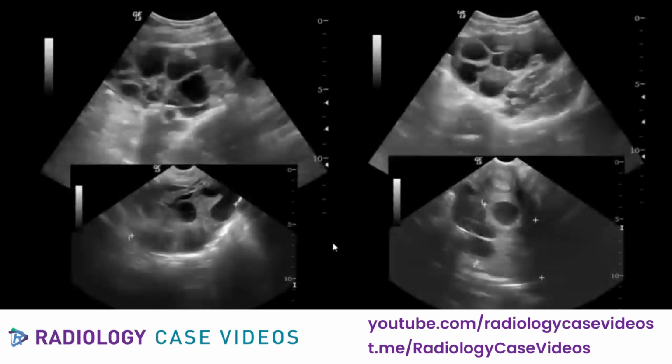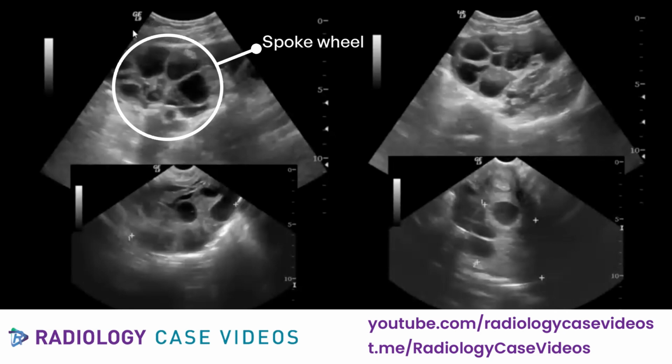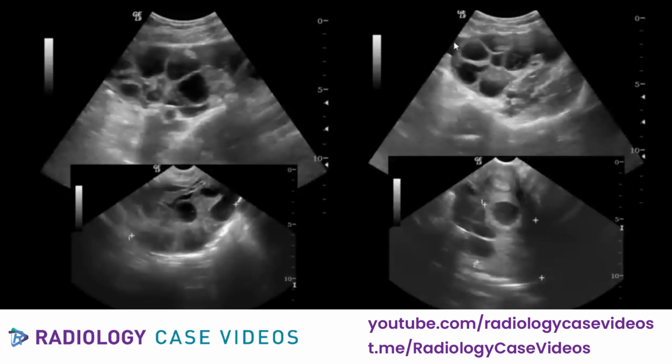Here, we are seeing a set of ultrasound images of the right and left ovaries that are near symmetrically bulky. The largest dimension of the right ovary is about 9.5 centimeters, and of the left ovary is about 8 centimeters. We can also observe multiple small cystic follicles of varying sizes, giving a spoke wheel appearance. We can also note some pelvic adnexal fluid.